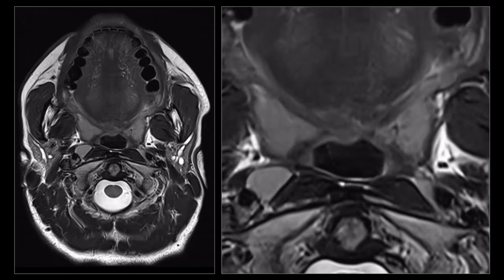I'm going to repeat it completely because that's the best way for you to learn. Well, I don't know if it's the best way for you to learn. It's the best way for me to learn. Once again, we see the uvula, we see the tonsillar fossa, and we see these muscles coursing towards the tongue and the posterior pharynx respectively, and these are the palatoglossus and palatopharyngeal muscle. And once again, here we have the superior constrictor muscle running in the posterior pharyngeal wall and laterally of the tonsillar capsule.